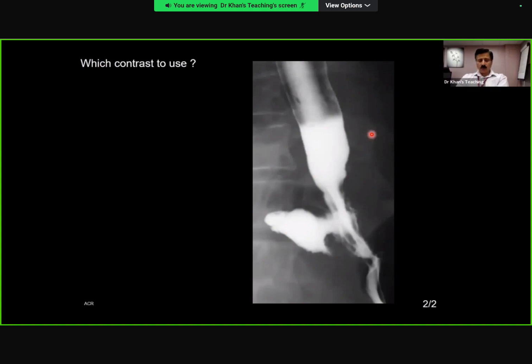I've seen quite a few. We work in a cardiothoracic center, so I've seen quite a few of them, and particularly on call. And this is a horrendous condition where a patient is absolutely fine and then has a bout of coughing and with this tear. So clinical history is very suggestive. CT is the correct answer. In the real world also you do a CT scan. But many a time the surgeons want a bit of anatomy, you know, can you please outline where the tear is, upper or middle or whatever.